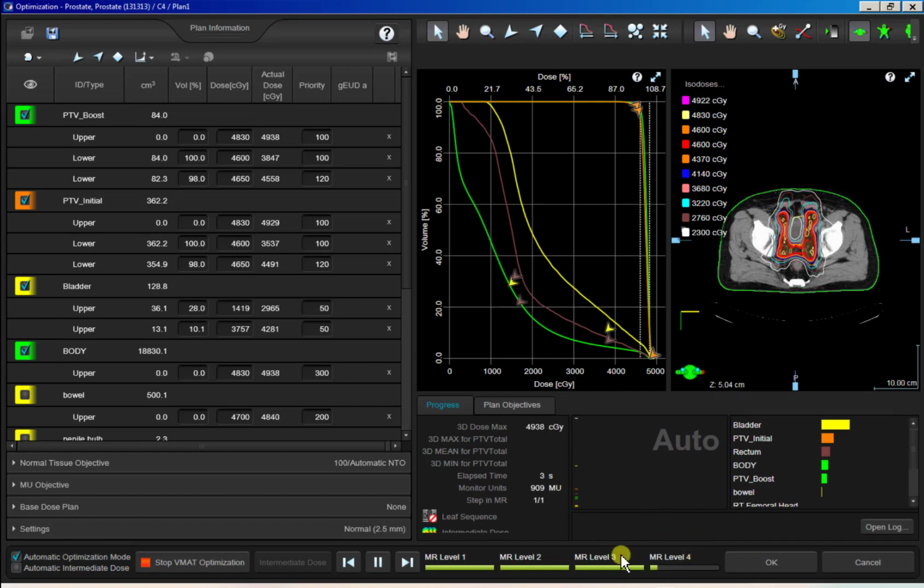What I do is back it up to level 3. I hit the pause button, and I treat it just like I treated this the first time I ran it, right? We should be really, really close. If I just need to tweak some of my doses here, this is where I do it. I do it again, okay?